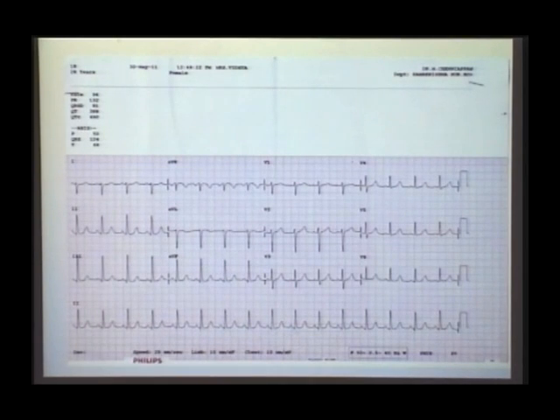What is the diagnosis here? I will diagnose left posterior fascicular block after excluding right ventricular hypertrophy is the answer. So when I ask you what is our diagnosis for this ECG, you must say, I will diagnose left posterior fascicular block after excluding right ventricular hypertrophy.